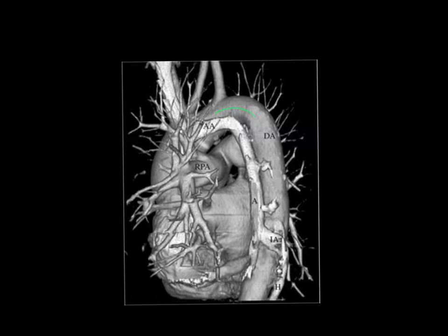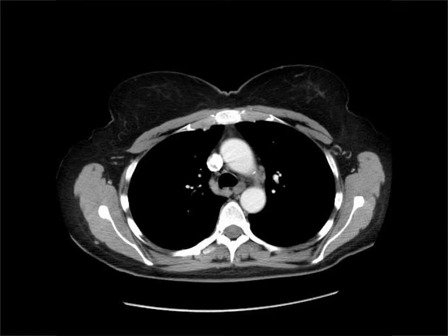So here is our aortic arch, and here is our azygos vein. It's coming up from the abdomen, it's running close to the aorta, and then it dives directly anteriorly, and it's draining into this structure which is hidden behind everything here, which is the superior vena cava. So if you imagine, what we're seeing is the end-on azygos vein, so it's kind of coming out of the screen towards us. Seen on a transaxial CT, it has its horizontal course, and then it will dive into this structure here, which is the superior vena cava, so we're seeing it that way.